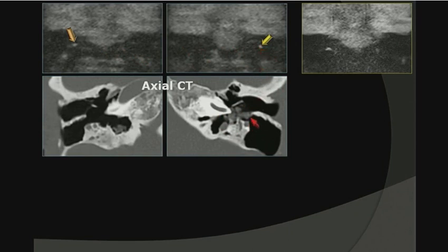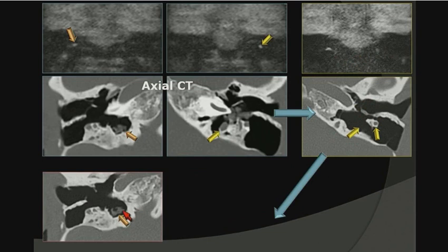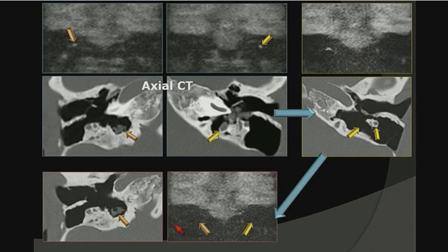So what did he miss? That's the facial nerve. This is debris from the surgery, and this is cholesteatoma in a sealed cell with bone above it. He couldn't see it. So he has to go in again. So he needs a new surgery, and we check again, and now he has dissected the facial nerve, and there you see that we actually see the cholesteatoma is gone. Now he does the other side, and on the other side he also takes it out, and everything's gone. Just imagine you have to do that without MR.